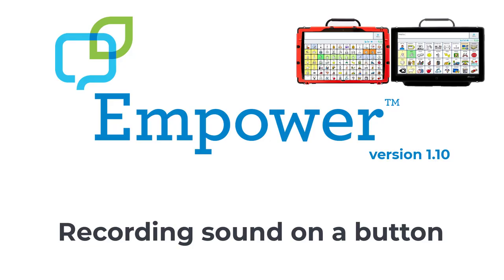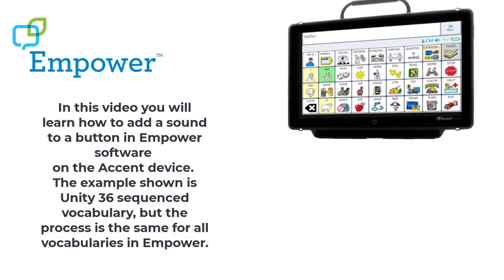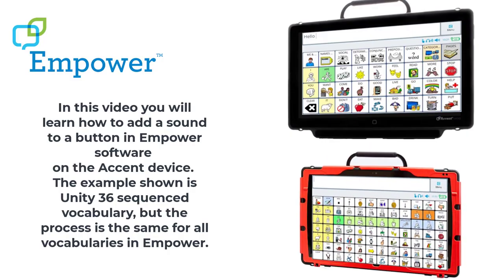Empower version 1.10. Now you can record a sound on a button. In this video, you will learn how to add a sound to a button in Empower software on the Accent device. The example shown is Unity 36 sequence vocabulary, but the process is the same for all vocabularies in Empower.